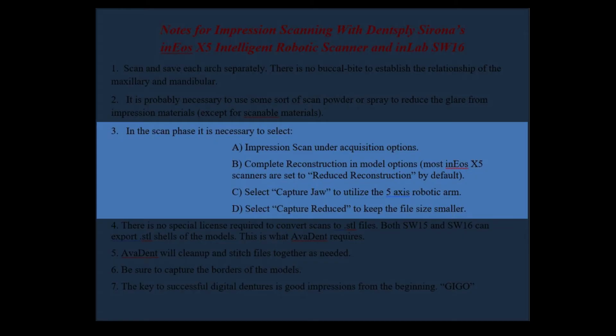Select capture reduced to keep the file sizes a little bit smaller. If you go capture area, it's high definition. There's a lot of triangles in the STL. It's more data, big files.